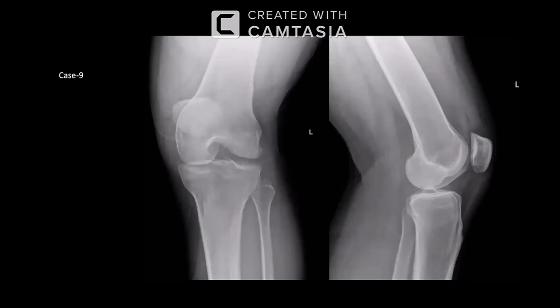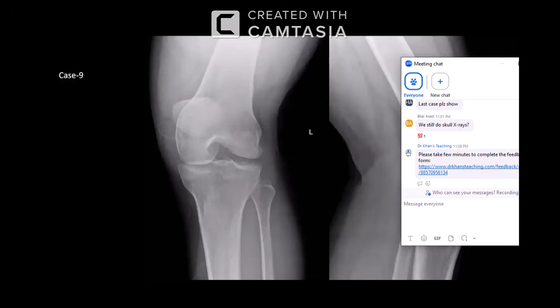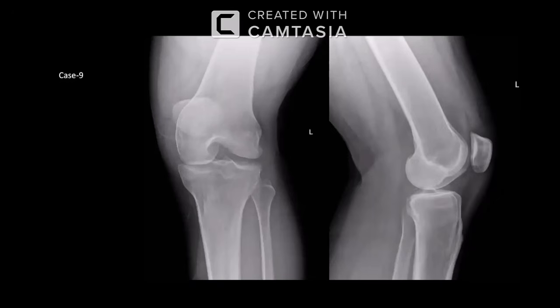Based on this finding of the asymmetric condyle of the left femur, as well as suprapatellar joint effusion and impression of lipohemarthrosis, I would further advise MRI knee to rule out further injuries, and I would like to see the horizontal beam radiograph if available. Horizontal beam. Okay.